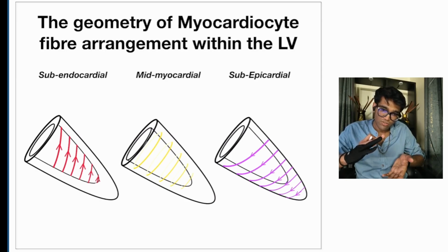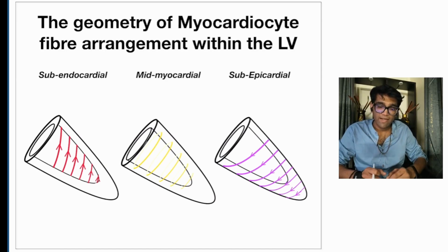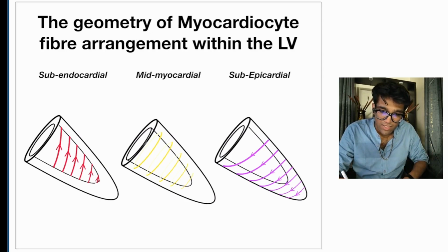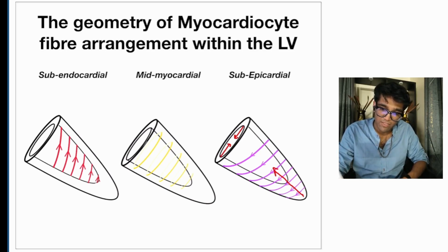After that, there is a radial contraction of the diameter of the mid myocardium as the mid myocardial fibers start to contract. Then eventually the subepicardial fibers start to contract. So there is an initial stretching of the subepicardial myocardiocytes and eventual contraction of the subepicardial myocardiocytes, resulting in a twisting motion. That twisting motion results in a decrease in the dimensions of the left ventricle, like this, towards the center of the left ventricle, and also essentially the apex and the base move closer to each other. So these are the dimensions that we will be measuring.